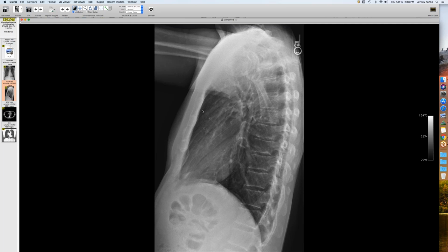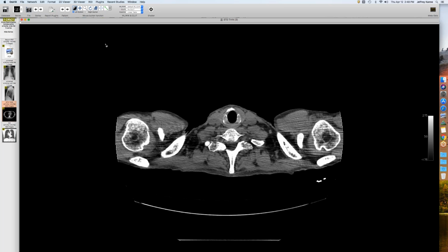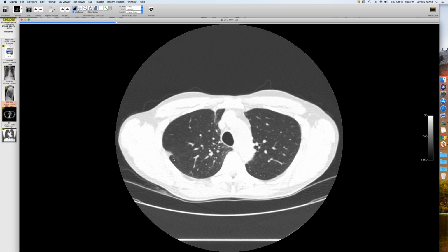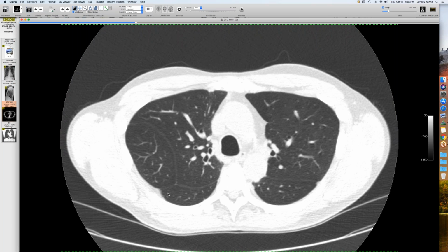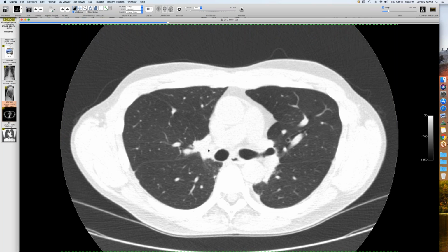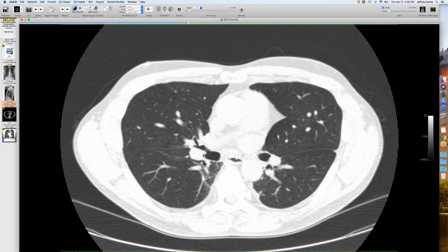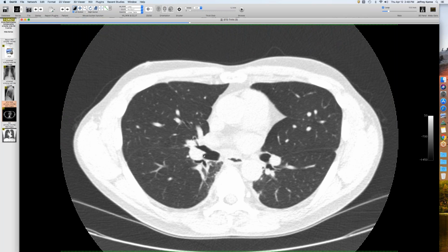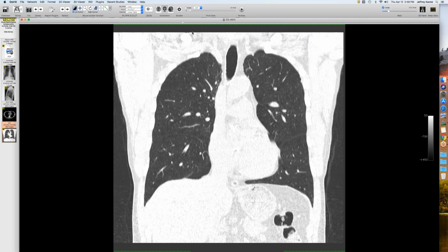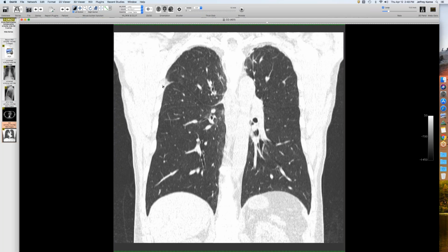But I've got a great CT to correlate with it. If I can get it to actually, there we go. So there was no nodule, but what we did see was this extrapleural fat along the fissure here, and the fissure has a funny anomaly to it, and there's all this soft tissue at the hilum and some stenosis there, and that may be from old TB or something else not related. But I show this case because it's a great example of a pseudonodule from extrapleural fat along this fissure here.